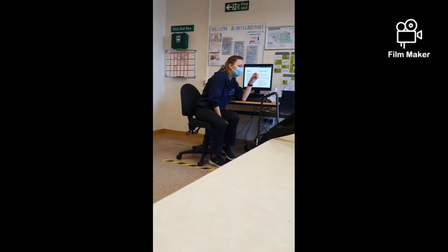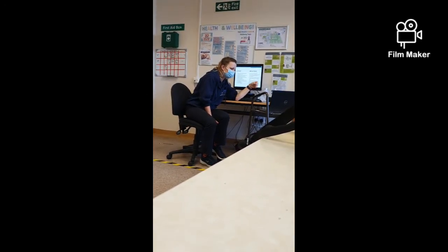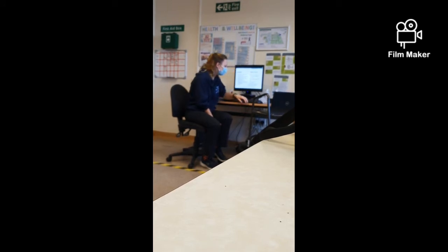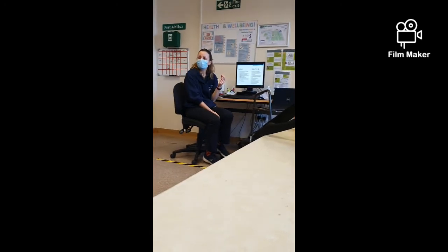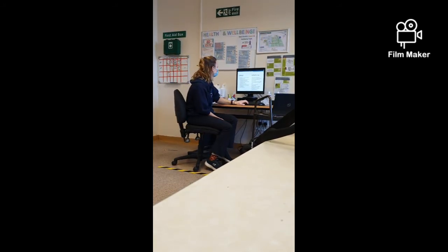Well, that is a good question. It's just like a white thickening at the edge of the lung that's not the ribs. I'll find some examples for the next session next week when we're consolidating everything, so you can see. I think I've got one saved, an example of a gentleman that you could see the pleura of, and actually he had a tumour there that had been missed because no one had looked at that part of the chest x-ray.